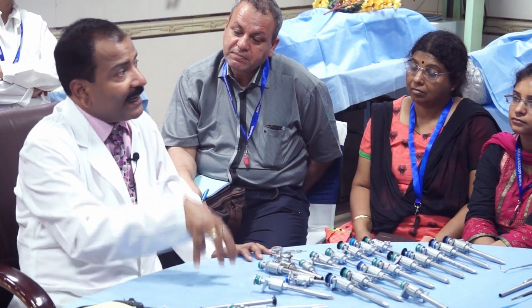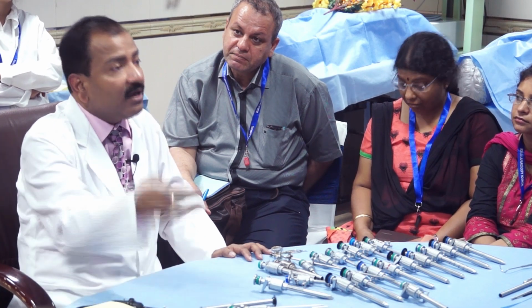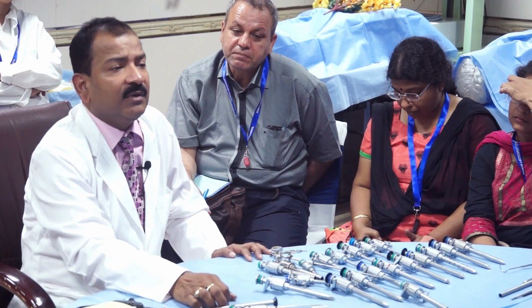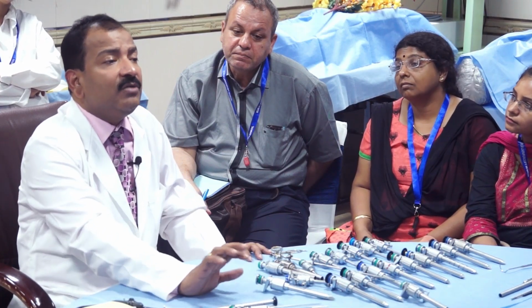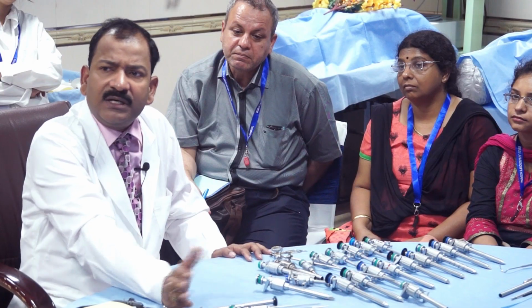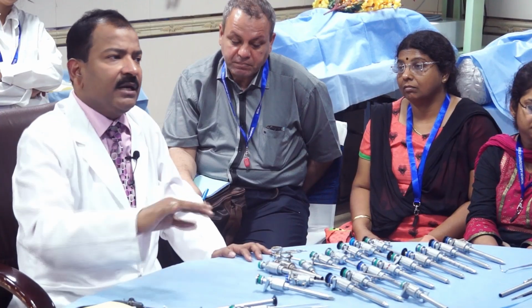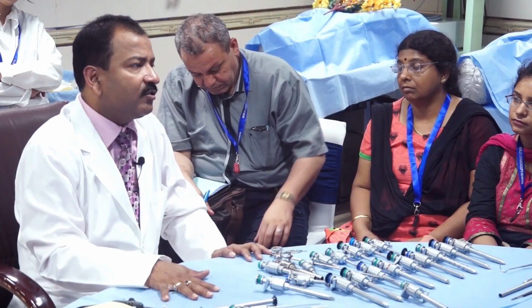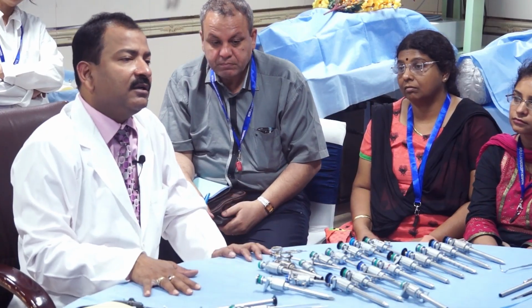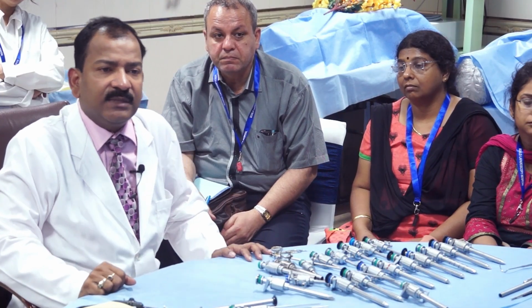Then you should know how to attach the different recorders, which cable to attach, and how to transfer that data to your laptop. Once you learn, it is only a 10-minute job. If you do not learn, you cannot do it in 1 week either, because training is required, and once you are trained, you can do it quickly. You can make a project and keep putting all the other videos in it. Your project is made once, and then it is saved in your computer. Now, you just add the main video and reproduce your video within 10 minutes.